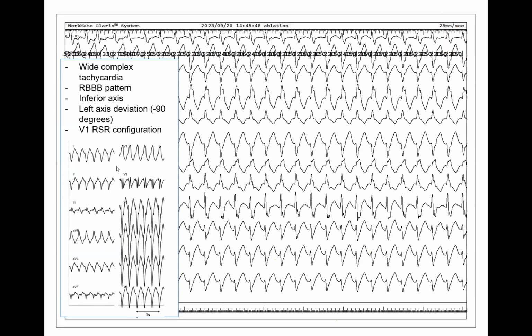Well, this is more like a fascicular VT ECG. Yeah. How about your patient? My patient, I don't understand your question. Sorry, lead one and lead three are inverted. Okay, I understand. You also measured the QRS complex in your case, right? Yep, 164, if I remember correctly. Your patient's QRS was 164. Yeah, 164. Yes, you're right.